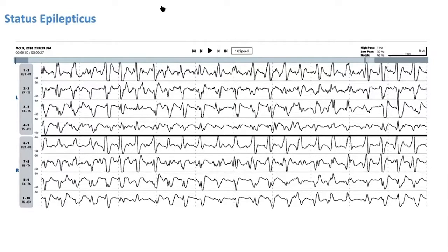But this is an EEG of severe cerebral dysfunction. And I would expect this person, can't know without seeing them, I expect this person to have real impairments, be unresponsive, and be staring off. And the fact that the person is staring off emotionless is why one's not seeing the artifact of a convulsion.